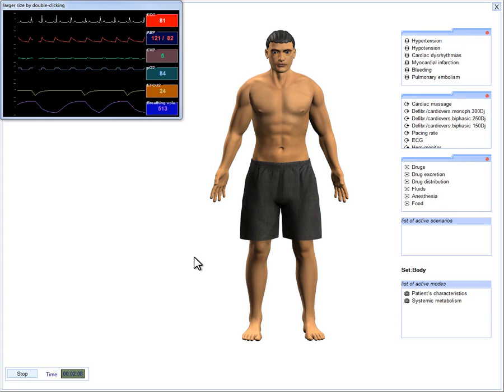The nervous system module of the pure MedSim simulator. No other simulation system can claim anything of this kind. The nervous system module may function as a separate subsystem. At the same time, it performs regulatory actions when the system is working as a whole.